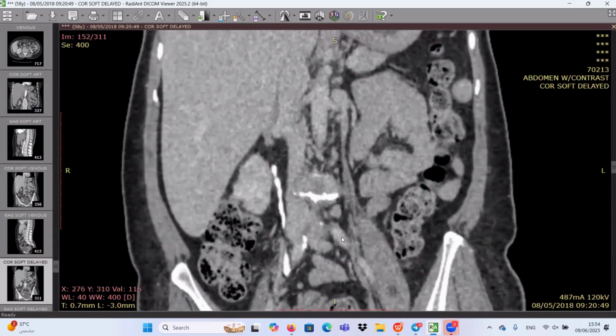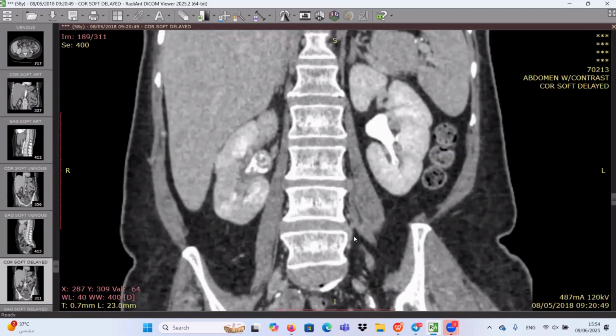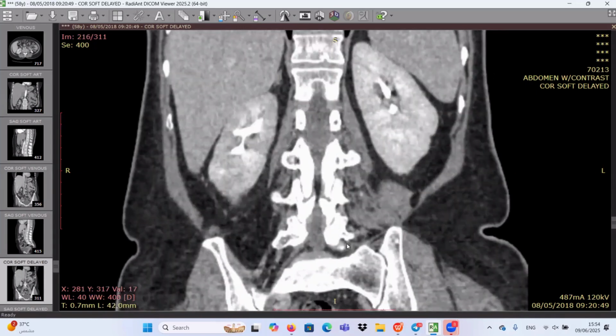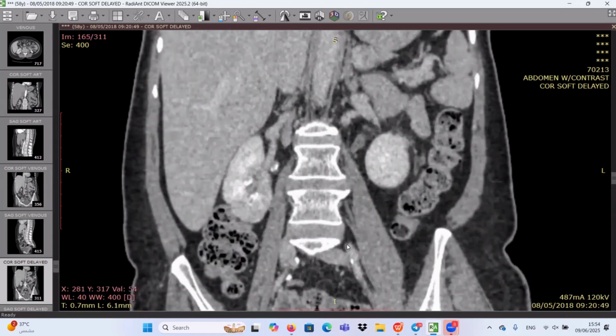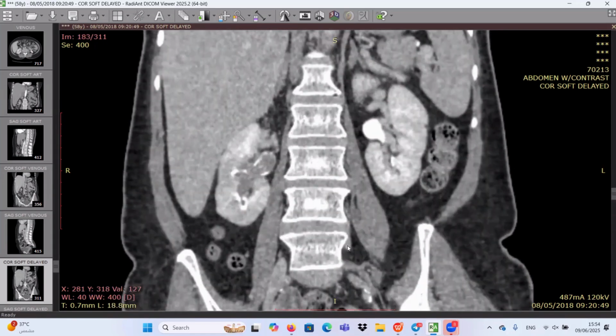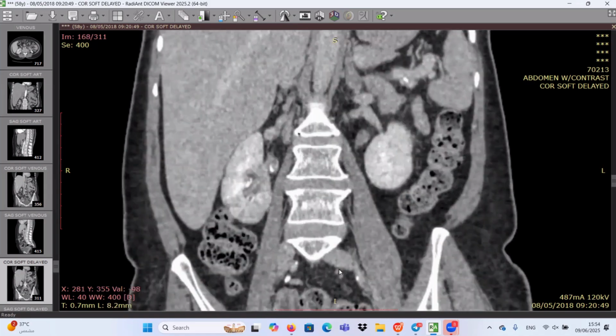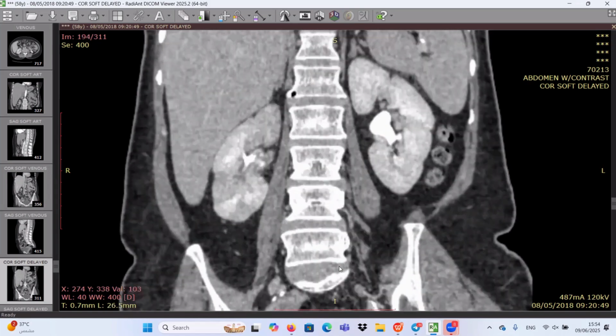I want to check the vascular contour, since this appeared to be irregular. I think it is related to a vascular injury, since I couldn't really appreciate the renal artery very well. And this hypoperfused area could be in keeping with infarction. Most likely, you did very well. We have hypoperfused patchy areas, wedge shape in configuration, either renal infarcts, pyelonephritis, or post-obstructive.